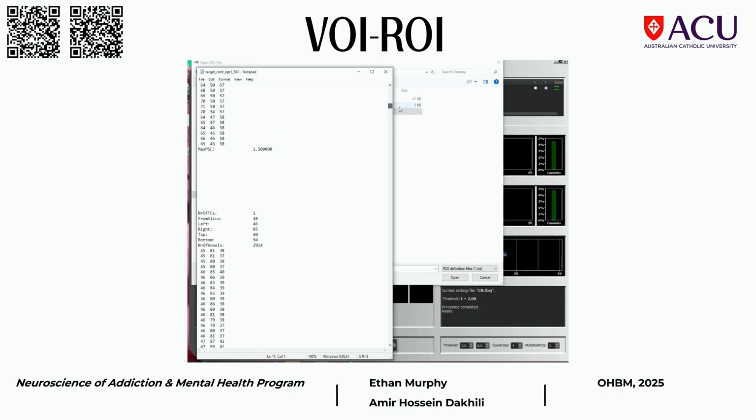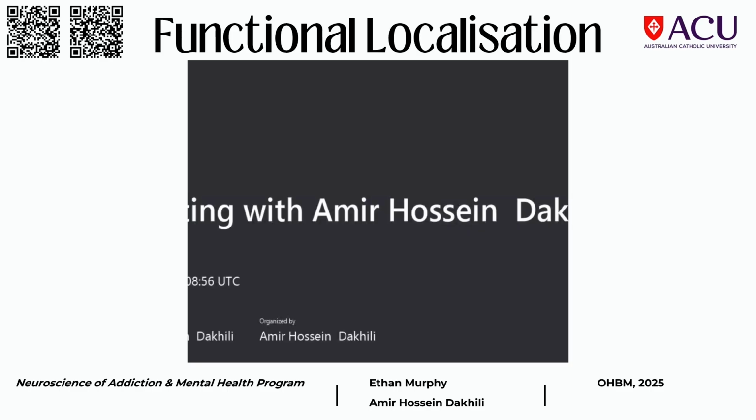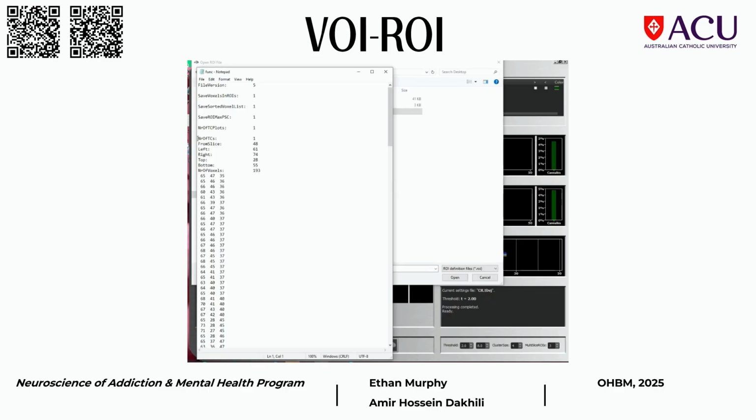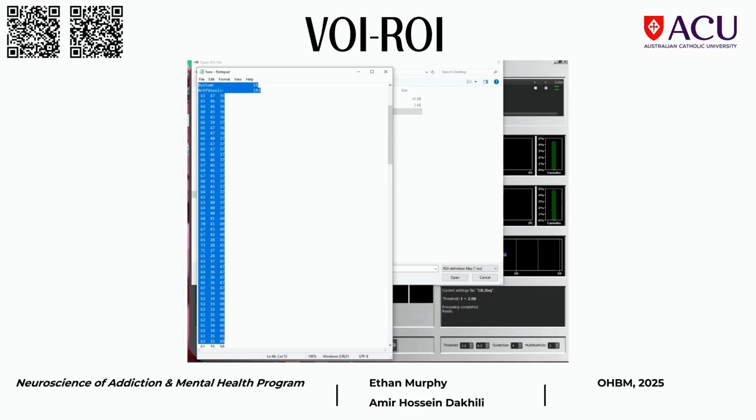It's to do with the temp. Yeah, you know what? Good catch. So it is to do with the template. You can see down the bottom, if this plays again, maybe. Basically what we're supposed to do is copy just until the final MNI coordinate and paste that into the VOI. But what was done here, and what we were doing beforehand, was copying everything.